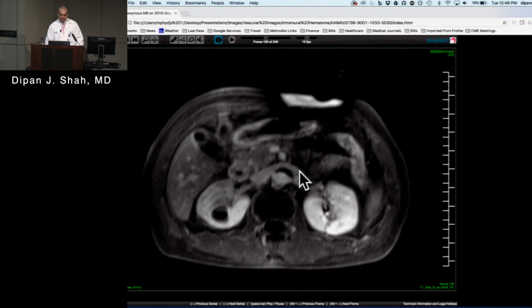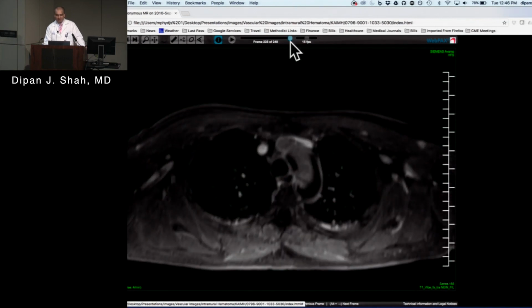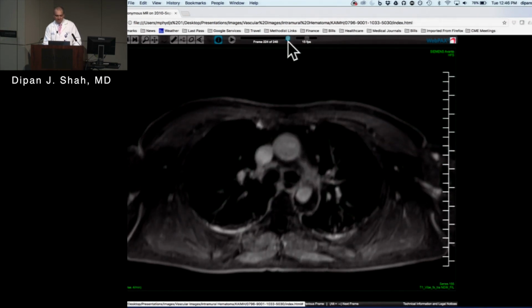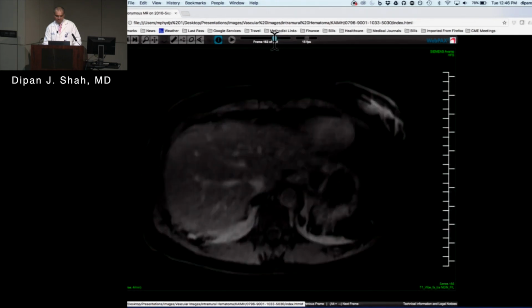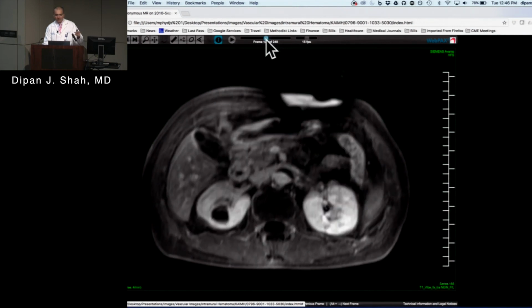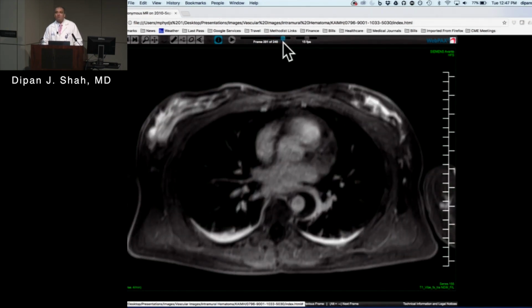And that's what this is here. Because this is now 10 minutes after contrast administration. And again, with this technique, you're looking to see if there's any contrast outside of the lumen itself. And what do you see? There isn't any, right? Okay. If you go all the way down, all you see is the lumen, which is narrowed, and then you see this dark area outside of it. Now, the question again is, could this be a dissection with a completely thrombosed false lumen, or could this be an IMH?